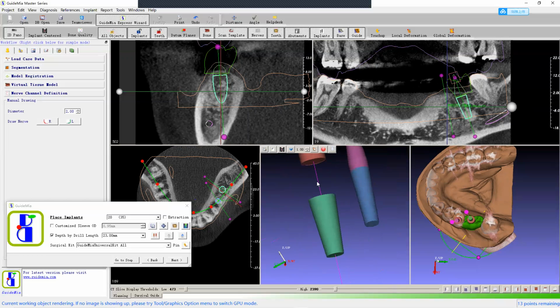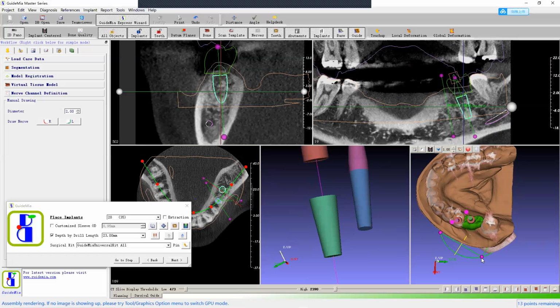Now we go to guide design. Remember, one question, because you had mentioned a while earlier that if you have a patient that is heavily restored, it's going to be a high scatter case. My description was a patient who's heavily restored, we don't have natural teeth, and it's going to be an immediate case.